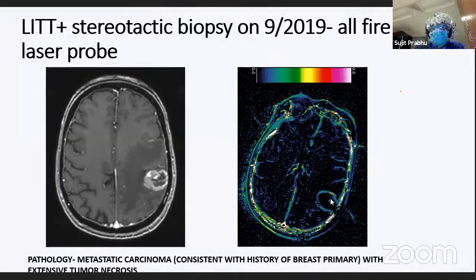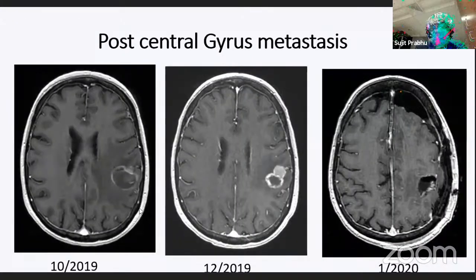I would like to bring to your attention a little blip here. You can see these little areas in the anterior aspect of the cavity where you see some increased blood flow. And we followed that area after treatment. This is a post-treatment scan after a month. You can see this area, which we thought was probably not covered, continued to evolve. And what was interesting about this particular area was that it was adjacent to a sulcus.